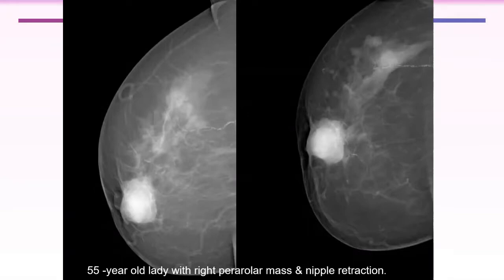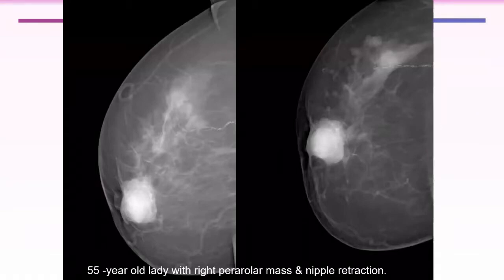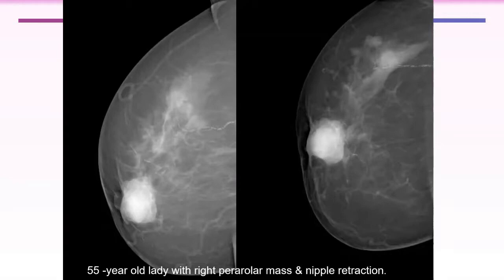When you have a lesion, you should look for other lesions. Is it a single lesion or multiple lesions? Is it important or not? Yes, it is important, but there is only a density or area of asymmetry, but I think it is part of the breast parenchyma.